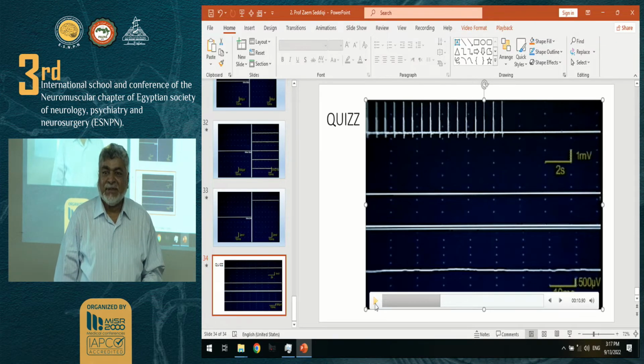In the ICU, if a patient's got a pacemaker, first of all, don't electric shock them. Secondly, recognize the pace fires very regularly. You can stand there the whole day, it keeps firing, unlike fibrillation, which will go away. If you're not sure, you wait a little while, because fibrillation usually goes away slowly after a minute or two. You stand next to the bed all day, it will keep going on. It's not a fibrillation. I just wanted to lighten up your day, and show you an artifact.